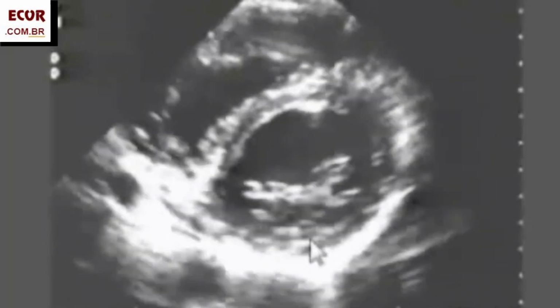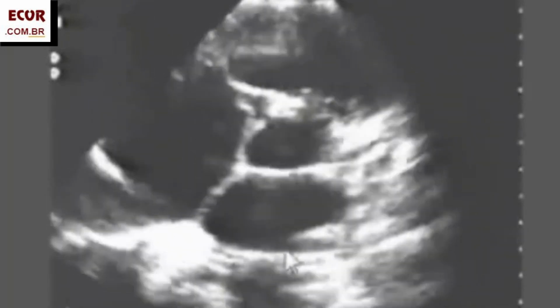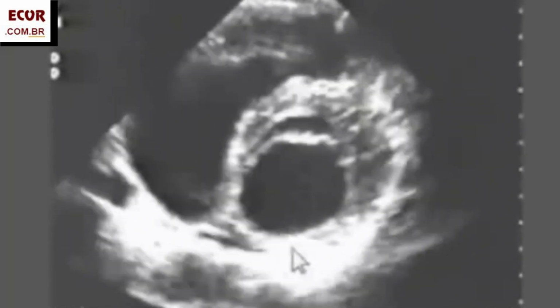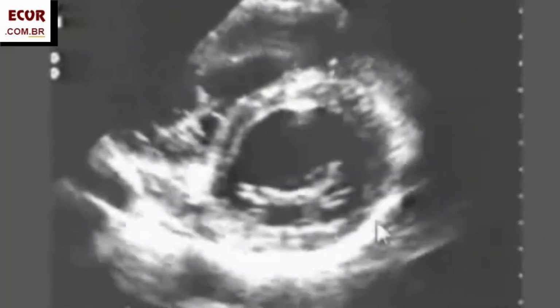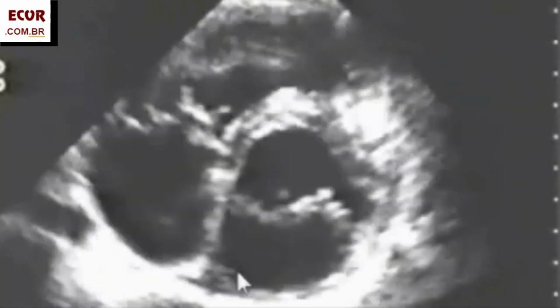Due to systolic apical translation of the heart, what you see in diastole is not what you see in systole at the same beam position. In this view, you are seeing the basal ventricular walls during diastole, and the mitral ring or even left atrial wall during systole. Since both move backward during systole, you may mistake it as a dyskinetic wall.